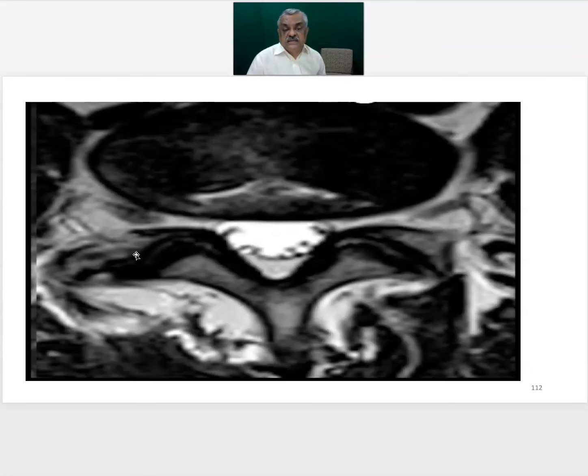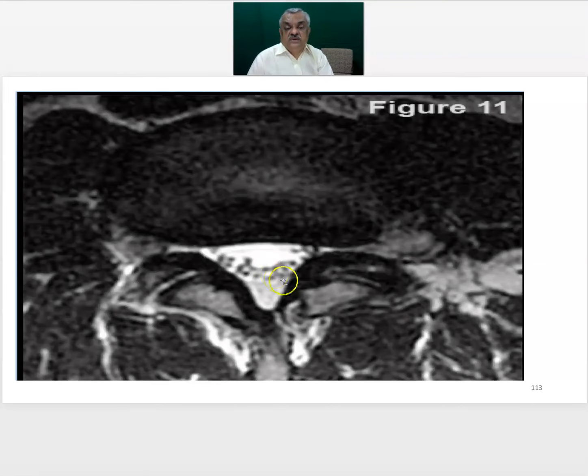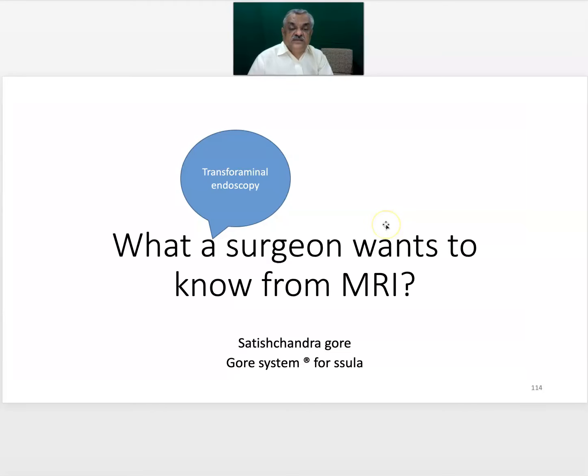Now this is again a middle zone section where you see the annular tears, and there is some portion in the middle which is below the ligamentum flavum, and we see the dural sac where all the roots are sedimented. A loss of sedimentation, as we know, is called as an important sign indicative of lumbar canal stenosis. The sedimented roots, the concavity, there's something happening here, extraforaminal area.